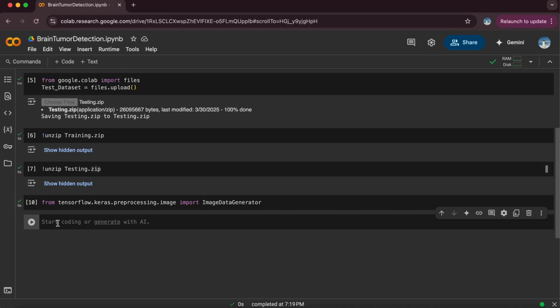The first step is ensuring that every image passed through the machine learning algorithm is the exact same shape. One of the most important steps is resizing all the images so they're the exact same shape, as in deep learning, input images must have the same dimensions because neural networks require uniform input sizes. We'll also normalize the pixel values by scaling them between 0 and 1, which helps training performance and helps the model converge faster. So here's the code to do so.